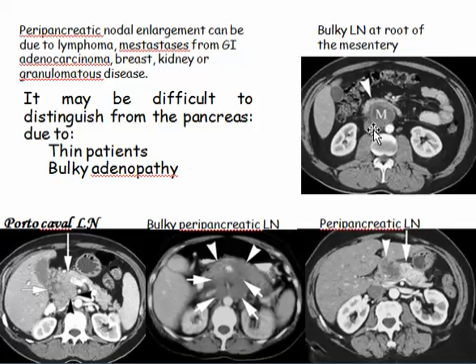So this is a retroperitoneal bulky mass at the root of the mesentery and the root of the pancreas: lymphoma, bulky lymph nodes encasing vessels, replacing and pushing the pancreas, so you cannot define it, and this is at the region of the head. So the presence of larger lymph nodes can sometimes hide the pancreas or invade it with the same process of disease, like in lymphoma.